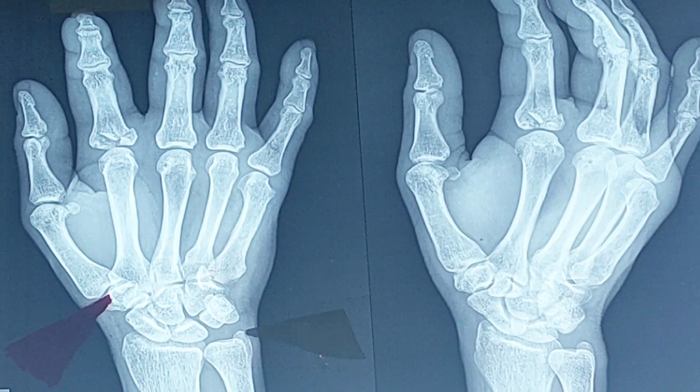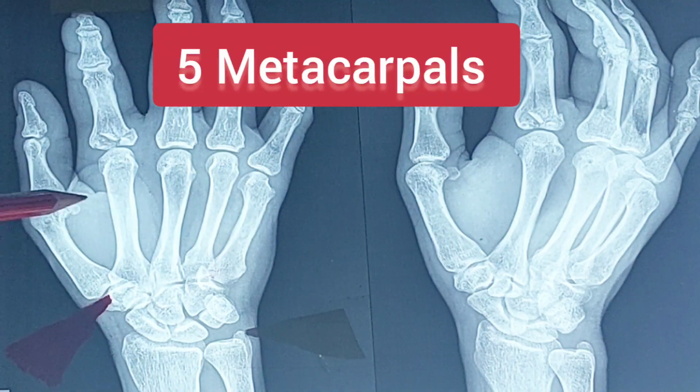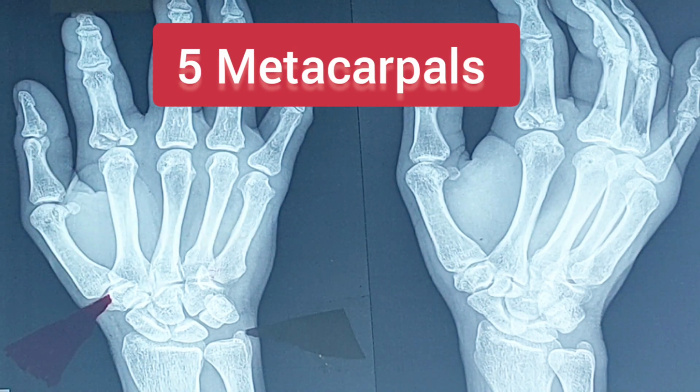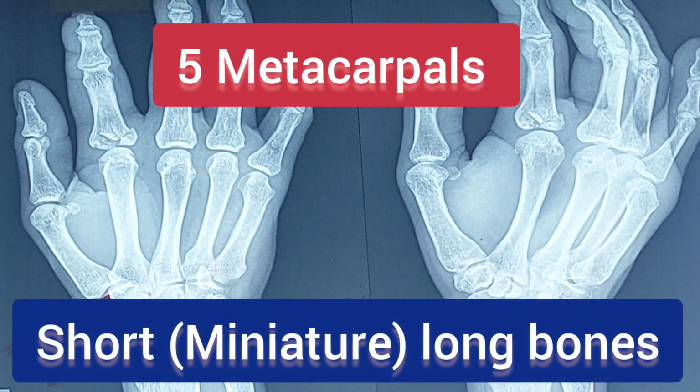Then come to the metacarpals. There are 5 metacarpals. So if you are asked to count the metacarpals, you start counting from lateral to medial side, not from medial to lateral. So this is first metacarpal, then second, third, fourth, fifth. And all the metacarpals are examples of miniature long bone or short long bones.